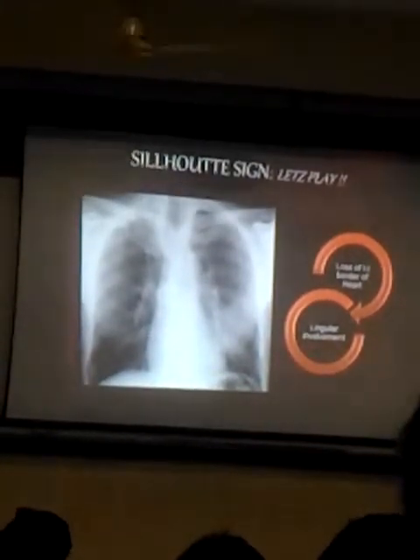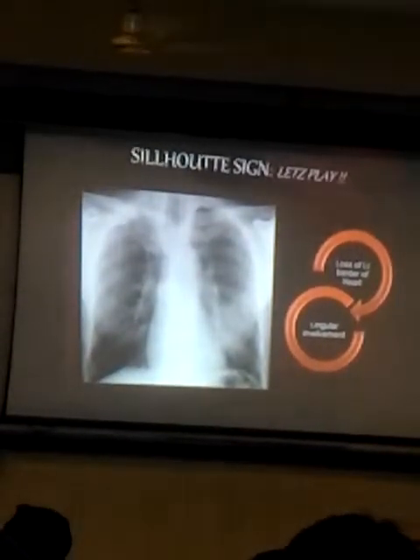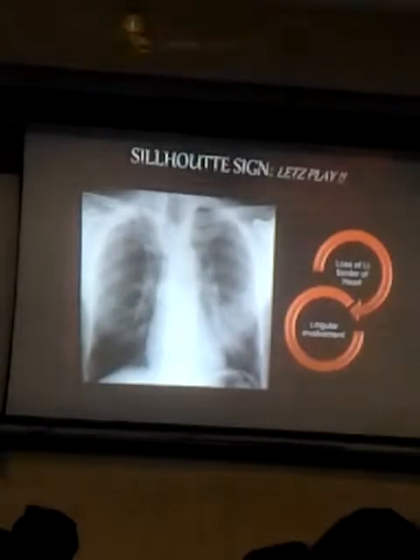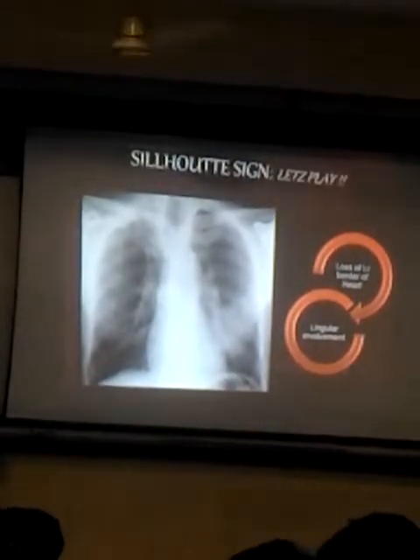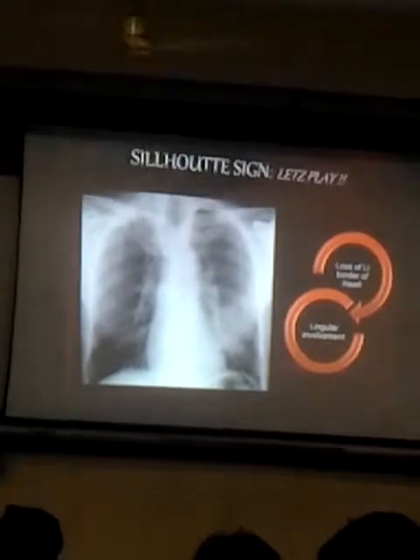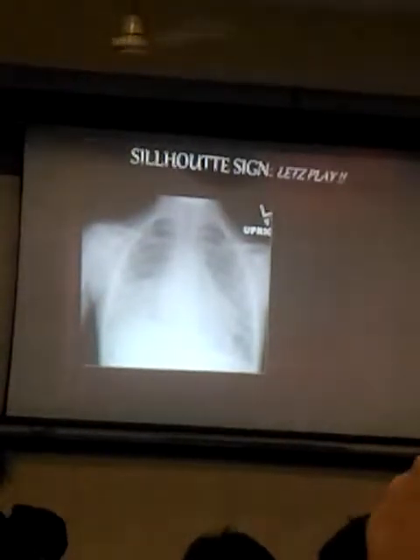But still, I am a very adamant examiner. So I say that you have been very lucky today, and that is the only reason why you are getting all these answers correct. So let me test you with a third radiograph. Believe me, the third radiograph is last but not the least in this series. It is not at all an easy radiograph to diagnose. It is a virtual radiograph, an underexposed film, and that too in this level of ambient light, it is definitely not going to be easy. Let us see if you get it right.